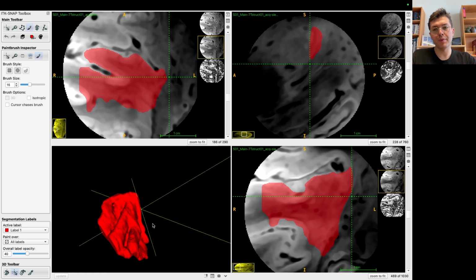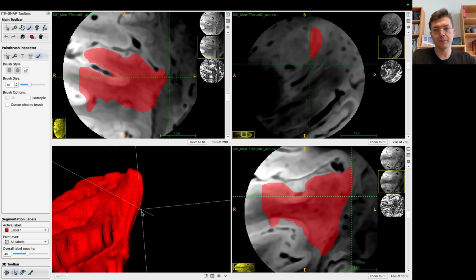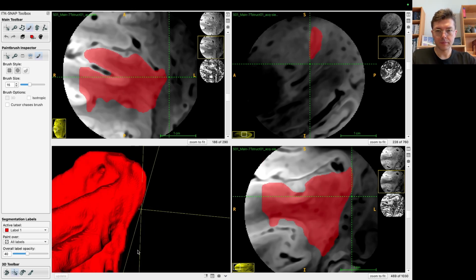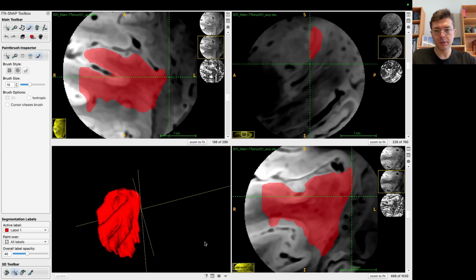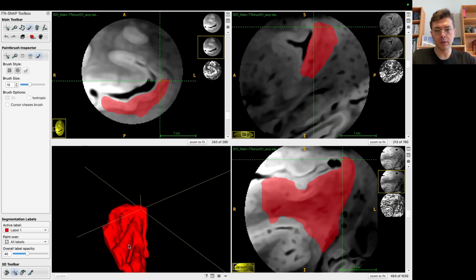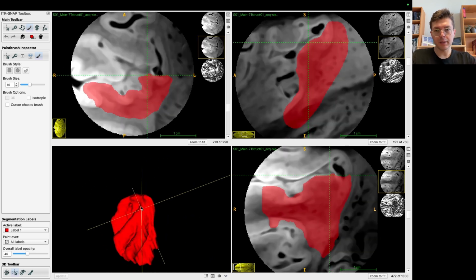It's already way better. Way better. See? So you can easily notice the features of the Heschl's Gyrus. Medial, lateral. You can click on it to understand which direction it runs. And basically we are going to analyze like a disk that is sitting here.